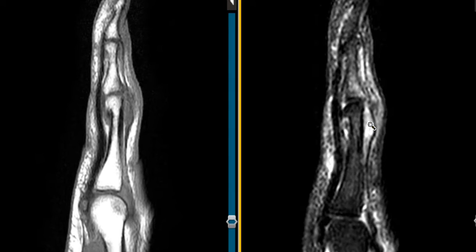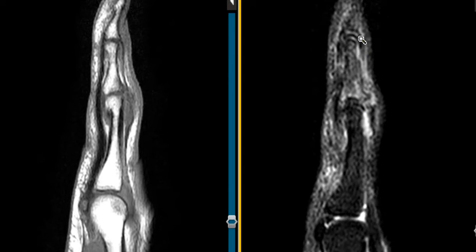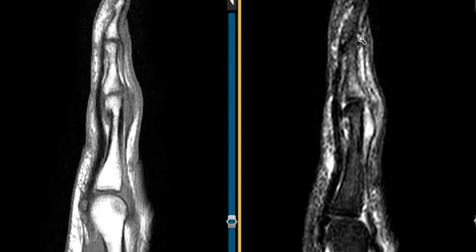and beneath that we see this brightness. This is some fluid or inflammation underneath. And again, those other components go around the outside, and they come over here to the distal phalanx. So this is a torn or ruptured central slip from the insertion, and there's also ossification here, which we don't see very well on the MRI, but this will require surgery.